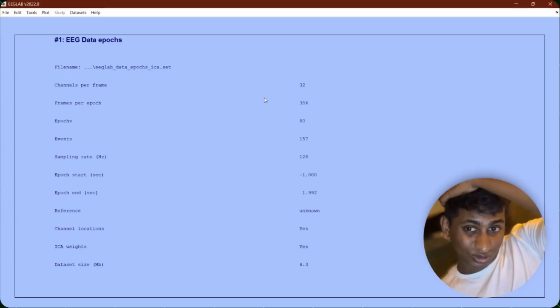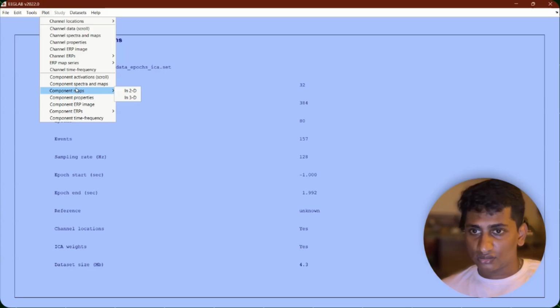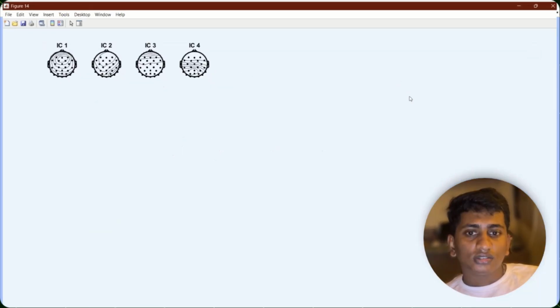So basically you will have everything here, right? I think now we get an idea of how exactly this is working. I know it's a complex topic. You need to run the data two to three times to understand it. It's not that easy to understand on the first try, but maybe you can try it by yourself rather than watching this. That's a very good thing. Next, epoching and baseline. We'll see details on that.